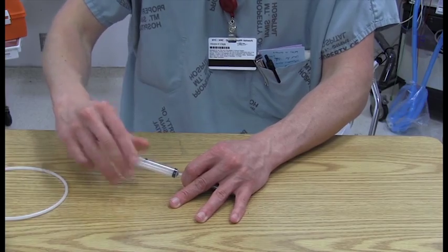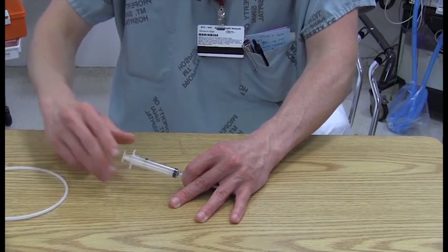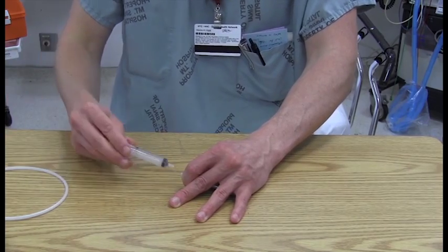And you should just practice time and time again, a couple hundred, a couple thousand times, to the point where you can disengage the hub of a needle without causing any movement to the hub. And when you can do that, then you're ready to move on to the next micro skill.